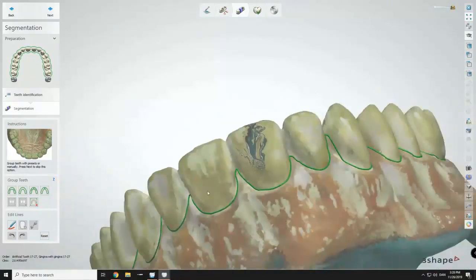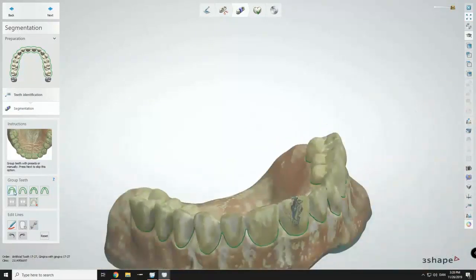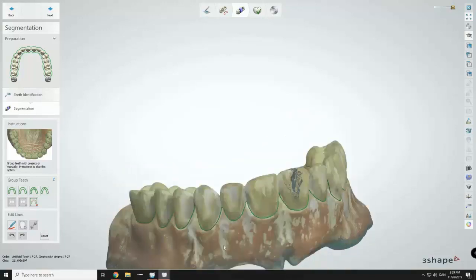And what you can do is, on the left, you see grouping the teeth. So basically you can decide what groups you want to do. You can split it into 3 groups as antagonist or a full arch denture, or even do individual teeth setups. And you can clear all the teeth blocks if you want to, and you can even do your individual blocks. So you select which teeth, the starting and the end teeth, and you do the blocks by yourself.